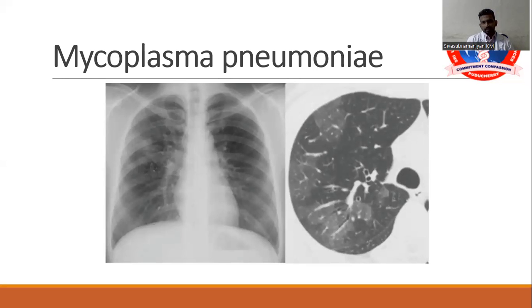But when you see the CT, you can see that there is literally patchy areas of peripheral involvement, and they are diffusely scattered. Although it is seen within a single particular lobe, you can see that it is not the typical bacterial staphylococcal pneumonia or the streptococcal pneumonia, lobar pneumonia that you usually see, where there is a peripheral area of consolidation. Instead, rather, there are ground glass densities, and they are ill-defined, and they are spread diffusely within a single particular lobe.